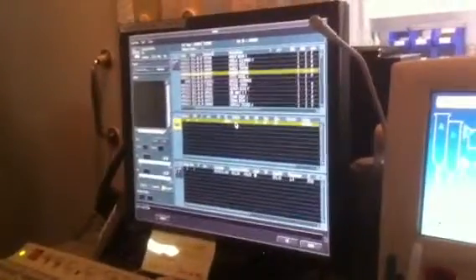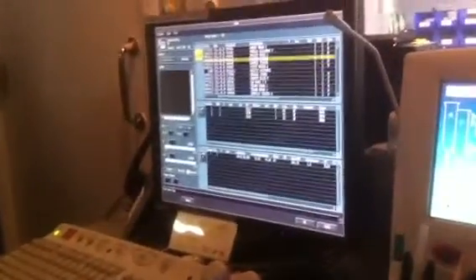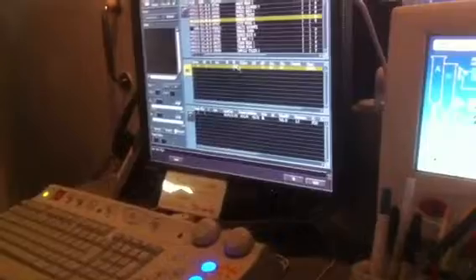And you've got two raw data that are two studies that will have the same exact raw data in it? No, actually this one here, this top one contains the brain. Oh, okay. This one contains the hip. Okay.